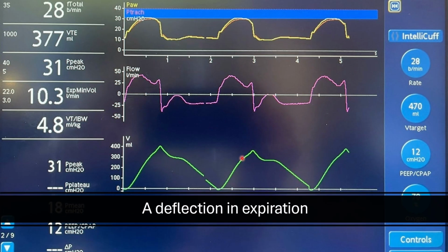Again, another one, you see positive upward deflection here. Can you see? Actually, a patient effort seen after the ventilator breath here. Sedatives do not eliminate RT. Remember that reverse triggering cannot be treated with the sedative. It will persist even more. In such cases, it is better to change the mode sometimes, and you can increase the inspiration.